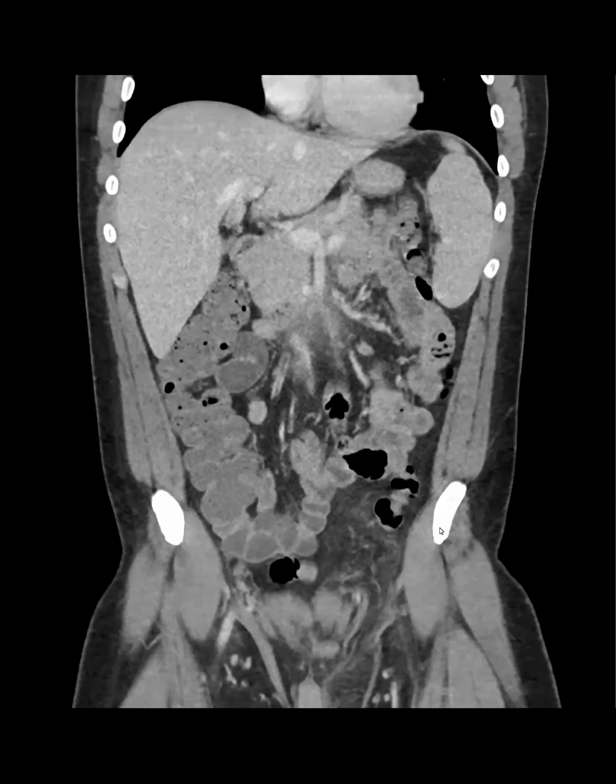So how did you end up figuring out that they have melanoma? We read the follow-up, and there you go. By follow-up, this patient also had renal cell carcinoma, so he just came back for renal cell follow-up, and when we saw the post-surgical changes here, we figured out what happened, and then just retrospectively noticed it.